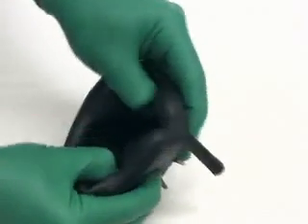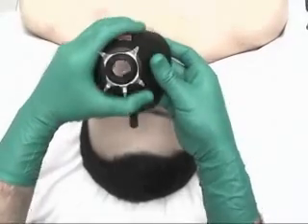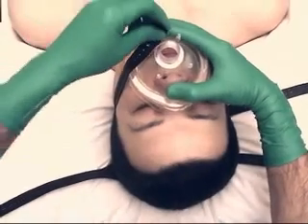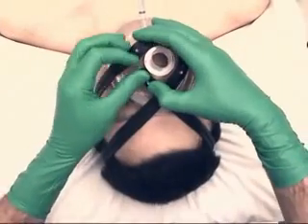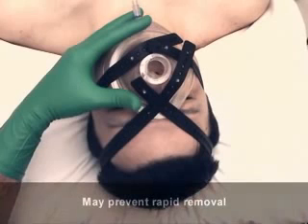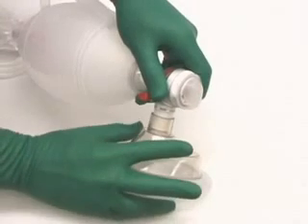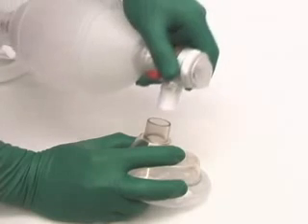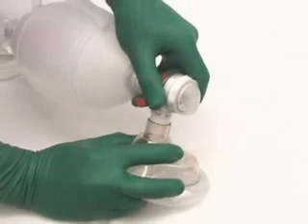Some masks have a malleable body, which can be molded to the face, thus reducing dead space. Masks equipped with a ring with hooks can be used with a mask strap to better hold the mask on the face, but may prevent rapid removal of the mask, for example, when suctioning the oral cavity is necessary. The connector of the mask is a standardized 22 mm diameter orifice and connects the mask to a bag valve device.